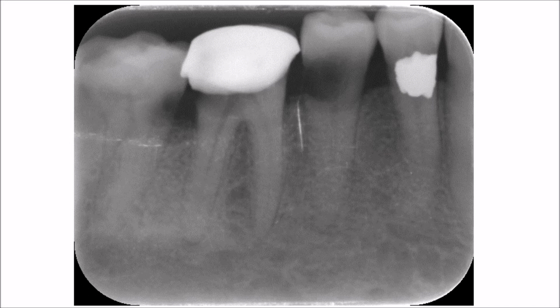Now I want you to have a look at the pulp of the tooth. Is the pulp involved in this case or not? No, I'm not sure, because I can't tell whether it is involved or not, but there is a radiolucency on the buccal or the palatal surface of the tooth, or buccal or the lingual surface of the tooth, that has cast its shadow on the pulp, which gave us this appearance of an involved pulp. Do not assume that the pulp is involved unless by clinical examination.